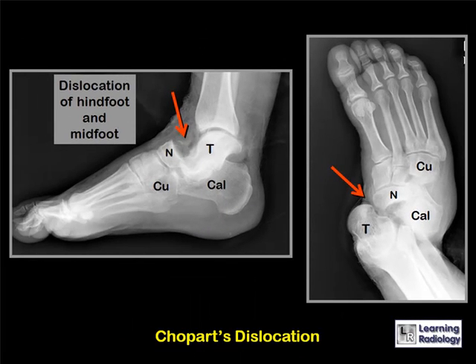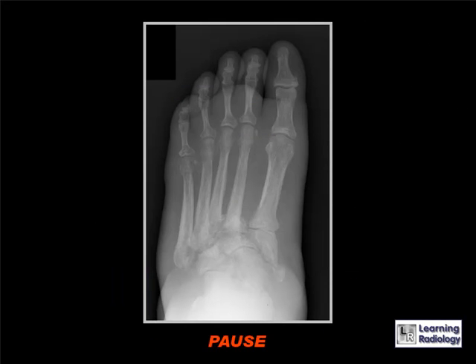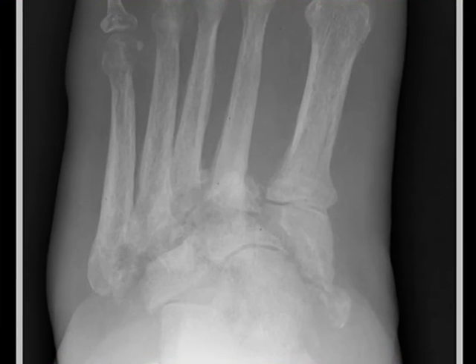It's time for your mini quiz. You can pause your computer or MP3 player as you look at this case and decide what you think it is.